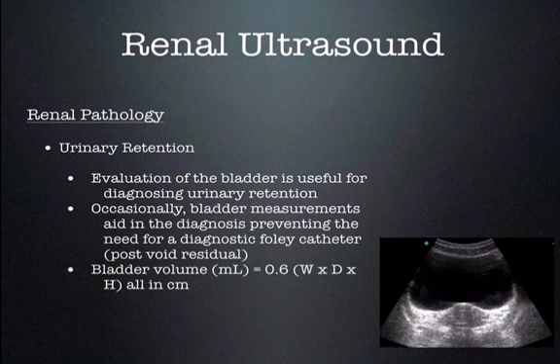Ultrasound can be an invaluable tool in the assessment of patients complaining of urinary retention. Calculating bladder volume is done by multiplying the bladder width, diameter, and height in centimeters by 0.6. This will give you a bladder volume in cc's or mLs.